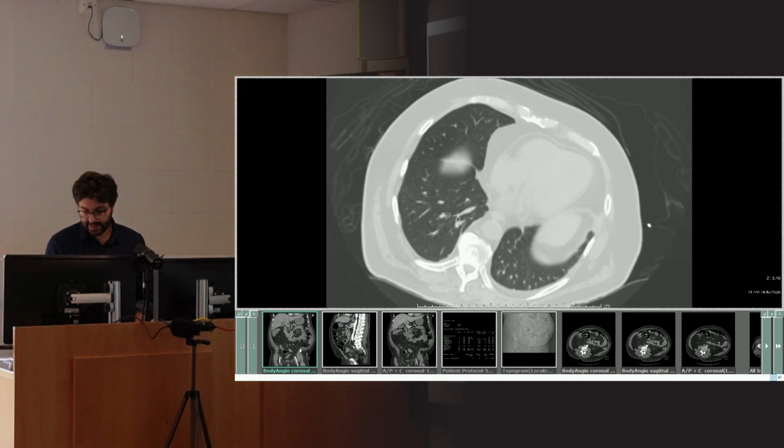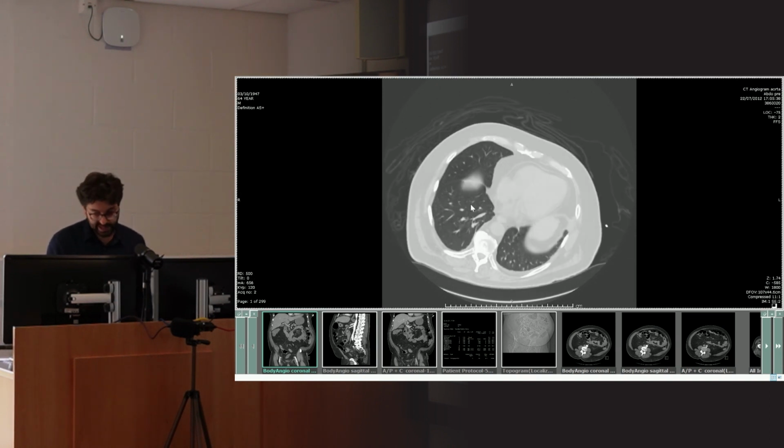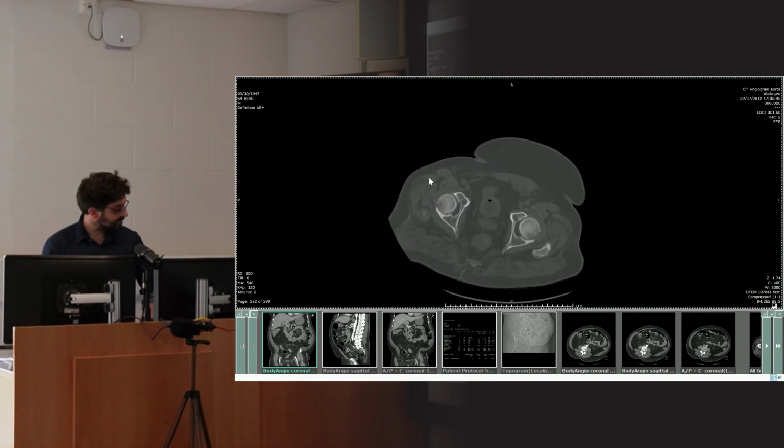However, what that then means is that everything in the abdomen now looks rubbish. It's all just white. Because again, all of our grayscales are focused in on the range that you get in lung. And what do you think you would do if you wanted to look at the bone? Where would you focus your Hounsfield units or your grayscales? Seeing if anyone puts anything in the chat.